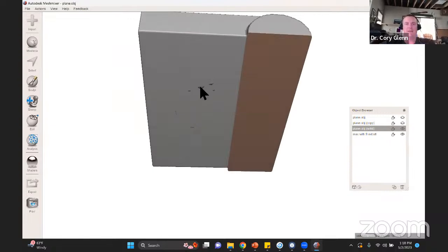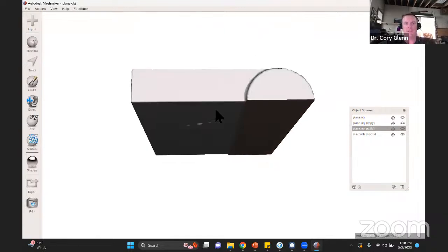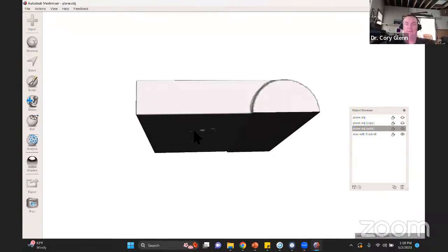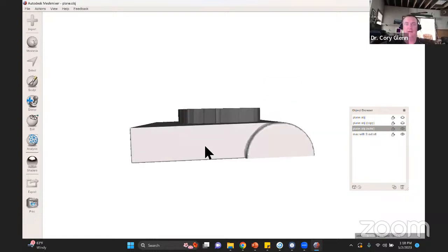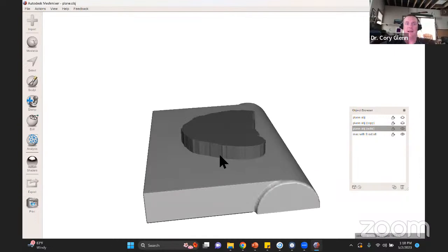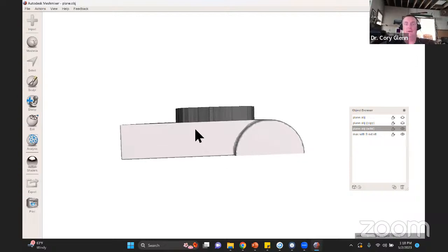If your prosthetic wax up that you've done has the teeth right here, how much space do you need for a hybrid? You need about 15 to 16 millimeters of prosthetic space. All right, well, your teeth cusp tips are right here, and this is 16 millimeters thick. So where does that mean you need to put your implants? It means you need to set your implants right above the top of this. And that means that you can also utilize this to make your bone reduction cuts.